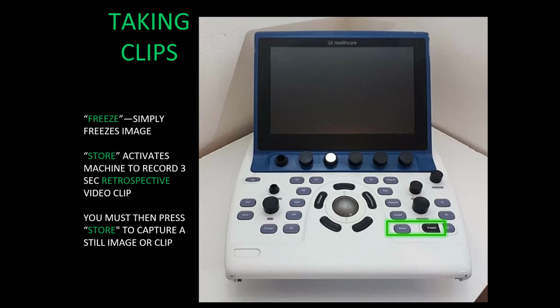You must then press store to capture a still image or clip again. You can also do this with a simple image. So if you press freeze and store afterwards, it will store the image and not an actual clip. Of course, to store and save images, you then need to enter patient data and end an exam.